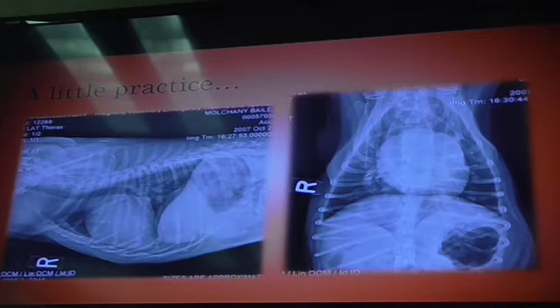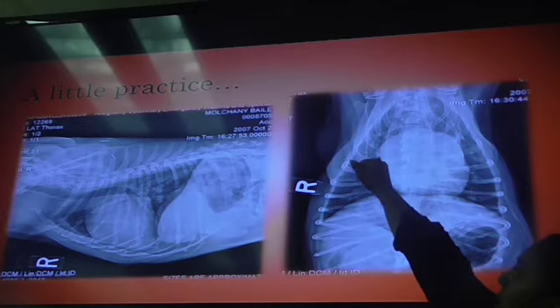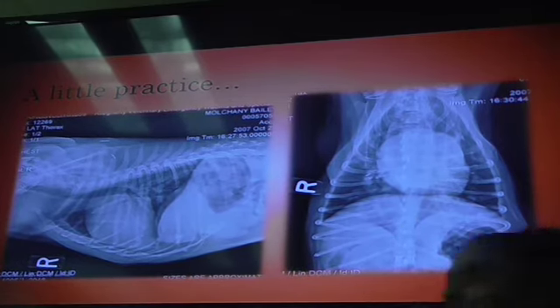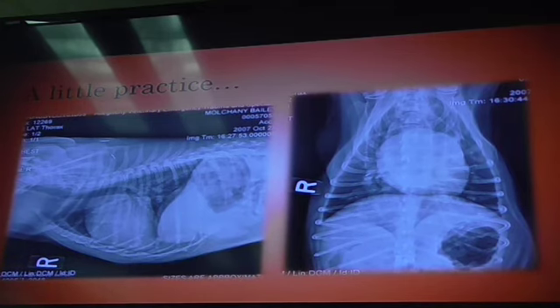You gotta build it. So this is where we start getting into those troubles, and we're going to get more practice in that, because when we look at left ventricle versus right ventricle enlargement, we sometimes get this false sense of ventricular enlargement. There's actually more of a bulge on the right side that's pushing that outward. You guys see it kind of rounded off a little bit? Let me point it out from the computer.